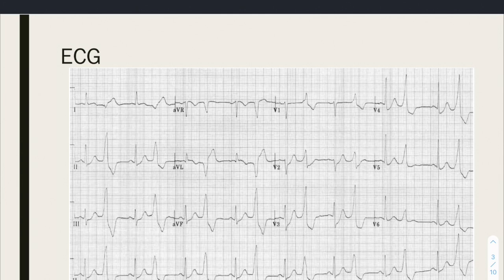Now, you know something is off in this ECG, so just to keep it straightforward, for our rate, we'll use the 10-second method. Remember, you can either use the 300 or the 10-second method, but just for this ECG, let's go ahead and use the 10-second method and see where that gets us. So remember, we're counting our peaks on the duration of this rhythm strip here.